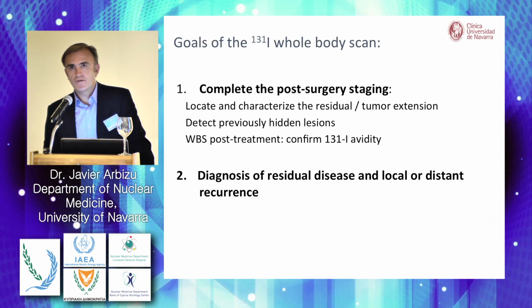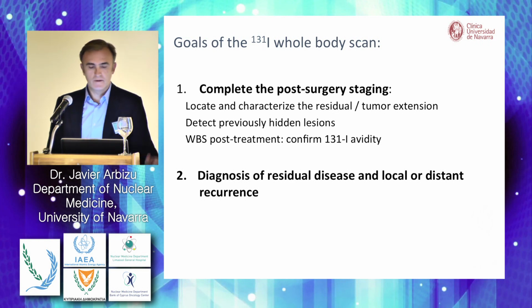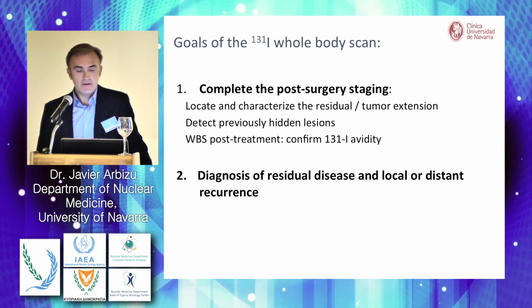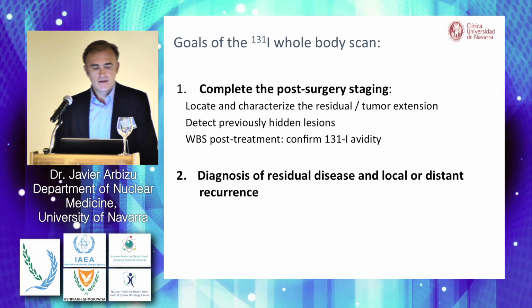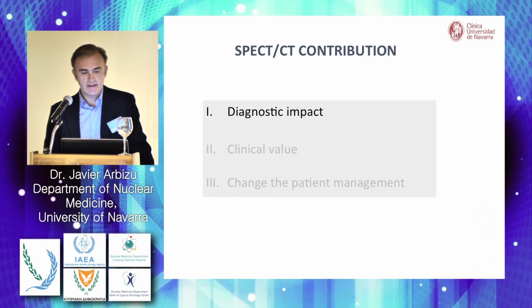The goals of the whole body scan after the treatment are two, from my point of view. One, complete the post-surgical staging, and also diagnosis, because it could be unknown in a new treatment. For example, this is the remnant treatment, and there could be a therapy treatment after, so we can diagnose residual disease or local or distant metastases.